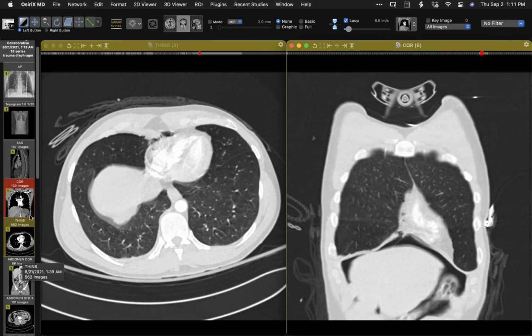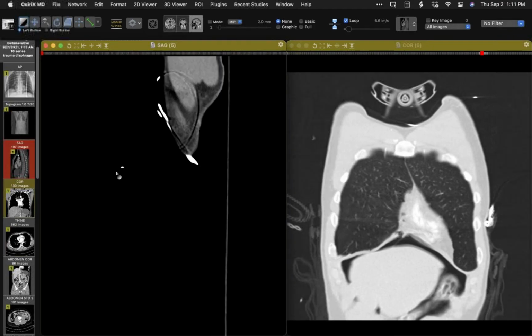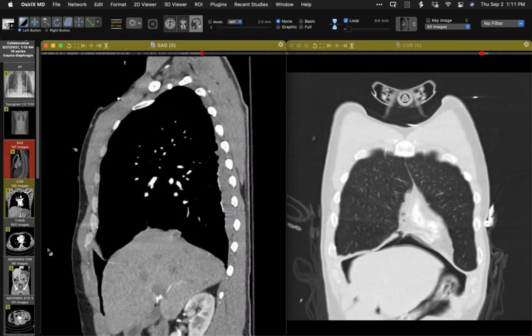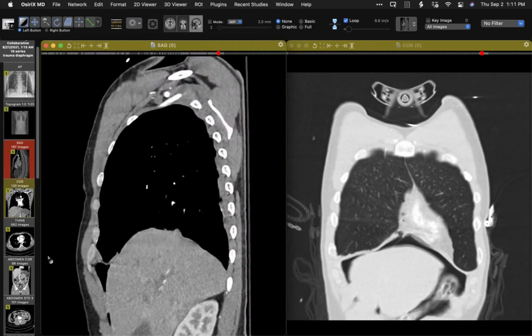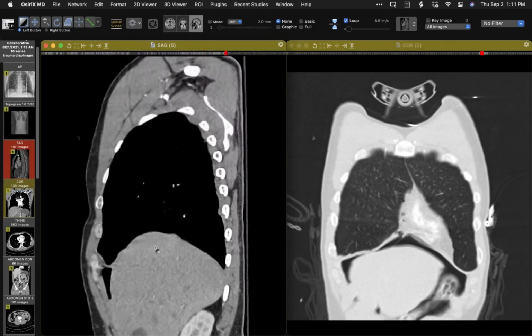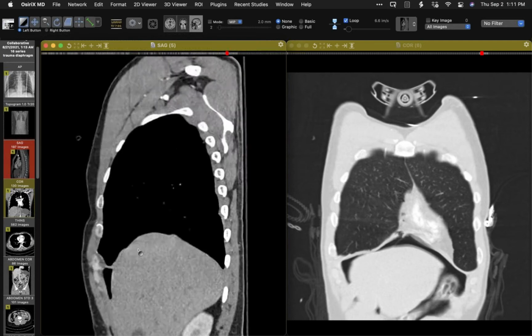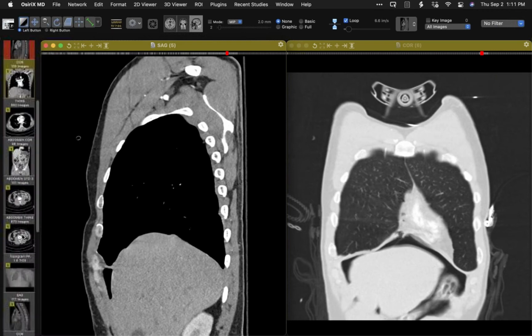Here I'll give you a feel for what things look like in the sagittal dimension, just on the mediastinal window. On that side, one does wonder about maybe little bumps and humps forming up here in relation to that. But the interesting finding particularly is the communication between the pleural space and the upper abdomen.